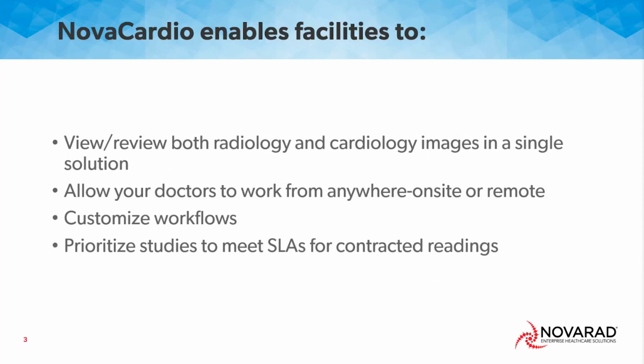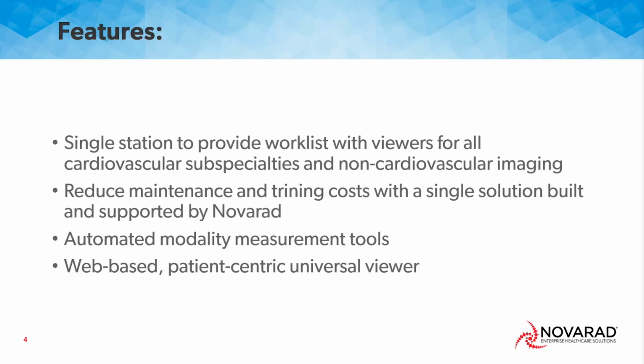NovaCardio enables facilities to view and review both radiology and cardiology images in a single solution, allows your doctors to work from anywhere, on-site or remote, customize workflows, and prioritize studies to meet SLAs for contracted readings. Features are a single station to provide work lists with viewers for all cardiovascular subspecialties and non-cardiovascular imaging, reduce maintenance and training costs with a single solution built and supported by NovaRad. That's training costs, by the way, I missed an A.